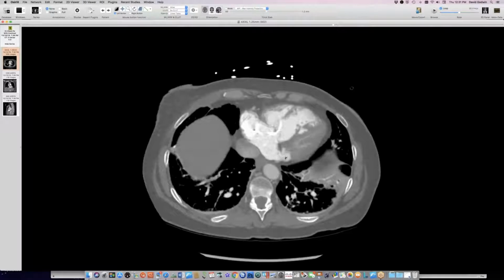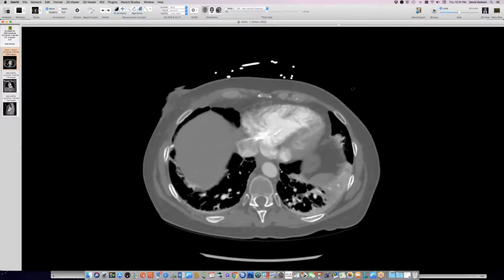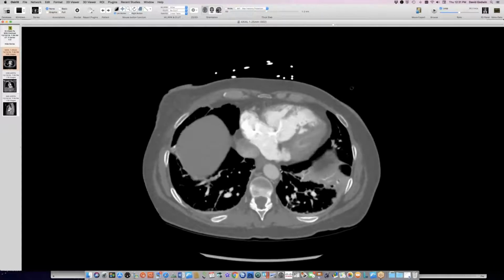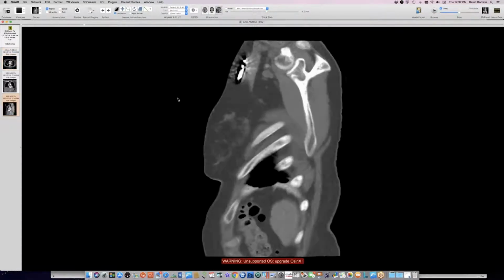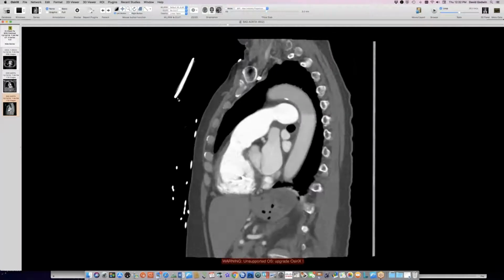In the region of the coronary sinus, he's calling it a coronary sinus aneurysm. Matt was wondering about that. Nobody's ever heard of that, so nobody in our reading room is familiar with coronary sinus aneurysm. No, it's dilated. It just depends if it connects with the left atrium or not, but I can't tell from these slices. We could not see a connection to the left atrium, and so it wasn't unroofed. The people did scrutinize for that. Here, let me show you the sagittal. I think that helps bring it out. So here's our abnormality.